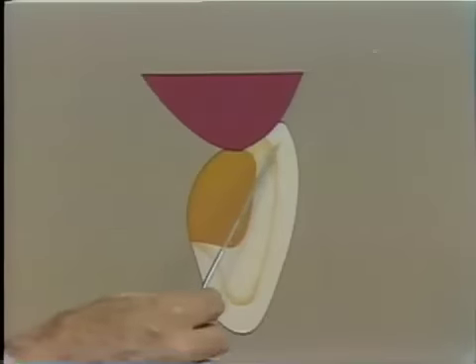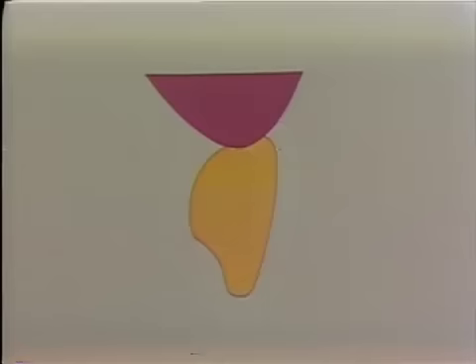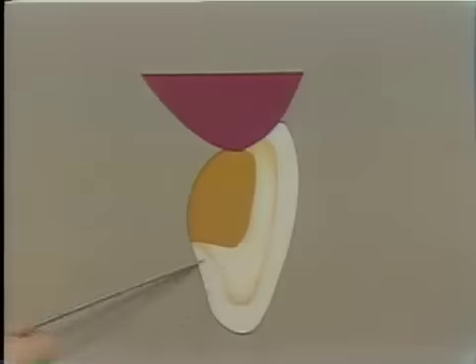This then is a relationship between the porcelain and the gold core. The even layer of porcelain over the labial, the incisal and round onto the lingual. The tapering edge leading off here and all around there, and the gold core exposed in the contact area for relationship to the adjacent retainer or Pontic.